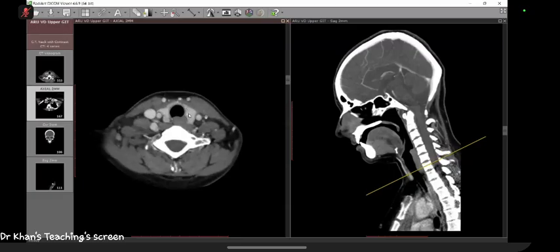And as we are going down, look at this. This is the thyroid gland. Thyroid gland is high density because it contains iodine. This is the isthmus, right lobe, and the left lobe. You see this thing? Now, this is your territory, and I'm going to teach you in this session what the upper esophagus is. ENT are not going to deal with this at this level, you are going to deal with this. And I'll teach you what is the criteria of thyroid invasion. It becomes a T4. You cannot treat it. You cannot do surgery on a CT scan if there is a carcinoma of the esophagus.